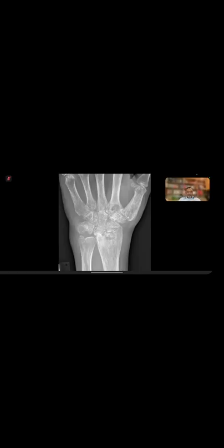Okay. This is another teaser for you. This patient presented with severe wrist pain. Okay, one-sided. So what is this? Patient won't let you touch it. Yeah, very good. Infection possibility because there is osteopenia. Septic, very good. Can be infection, can be rheumatoid. Sympathetic, well, yeah, can be.